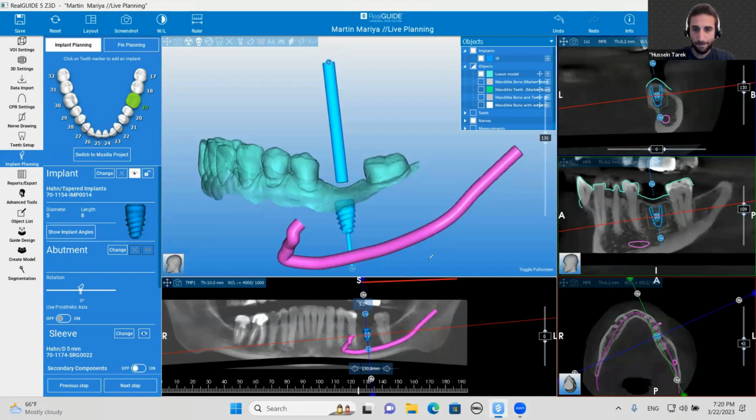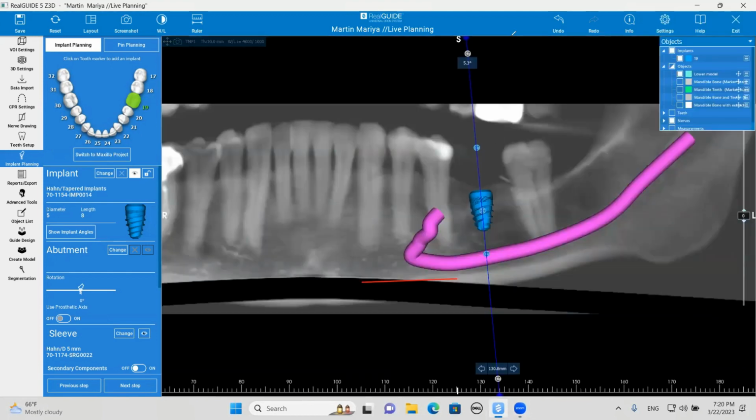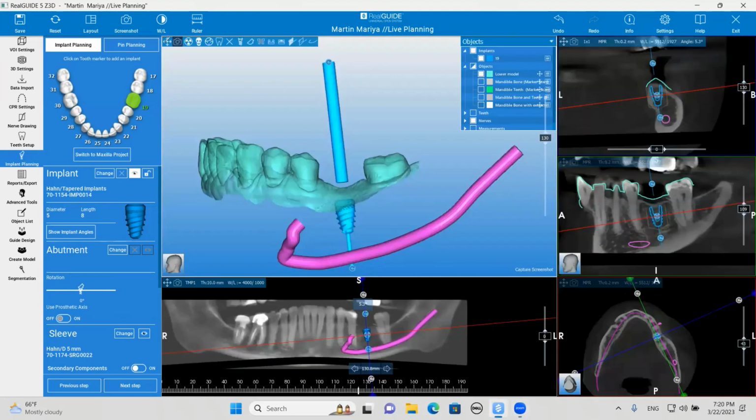Let's go back, Scott. I want to show you, I'm going to say just a little bit above the mid-root level of the bicuspid, and that molar is extremely long, but it is the crown to implant ratio. I was thinking not the crown to ideal ratio. When you're looking at apically and coronally where the implant is on the pan, it's going to be a little deceiving. It looks like it's pretty low, but go ahead, Hussein, and go back to that 3D image.